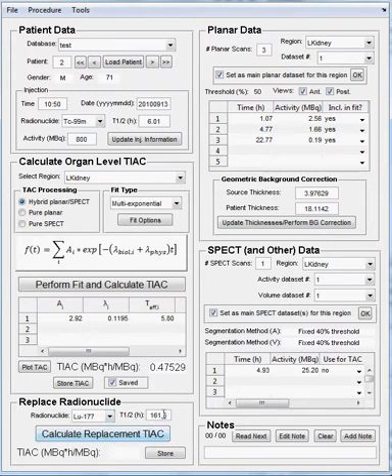There's the corresponding half-life for lutetium-177. This is what's going to be used in combination with the biological half-life, which you get out of this effective half-life from the technetium injection, and with an updated effective half-life for lutetium, we can calculate a replacement time-integrated activity coefficient.